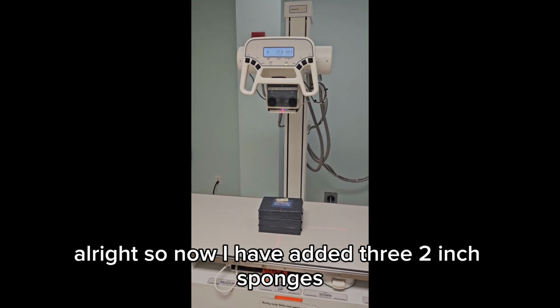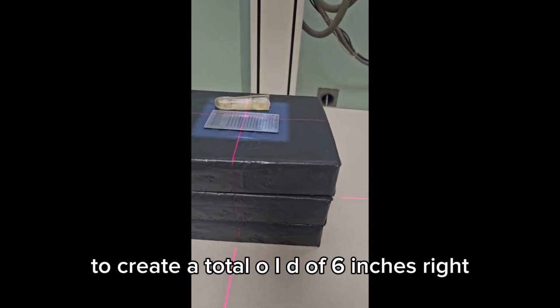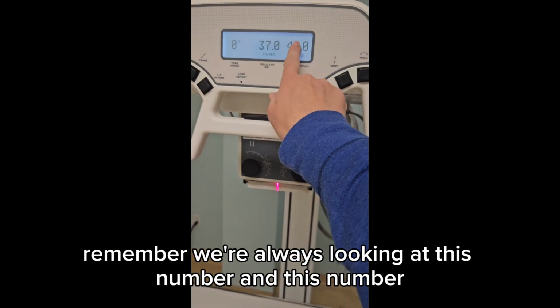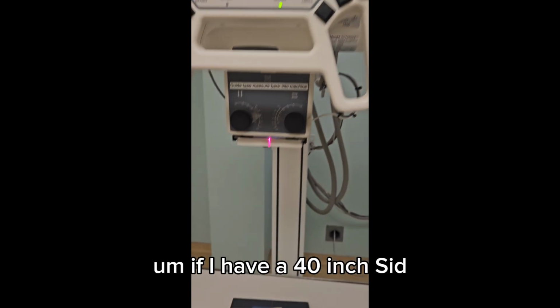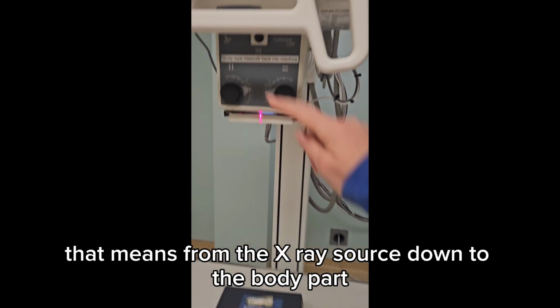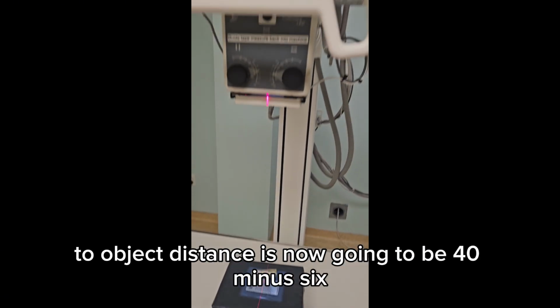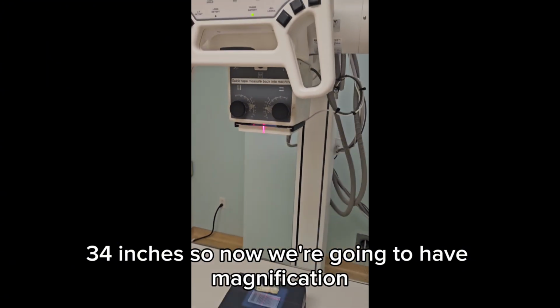All right, so now I have added 3 2-inch sponges to create a total OID of 6 inches, right? So if I'm still shooting at 40 inches, remember we're always looking at this number, if I have a 40-inch SID and now I have a 6-inch OID, that means from the X-ray source down to the body part is going to be our SOD, source to object distance, is now going to be 40 minus 6, 34 inches. So now we're going to have magnification.